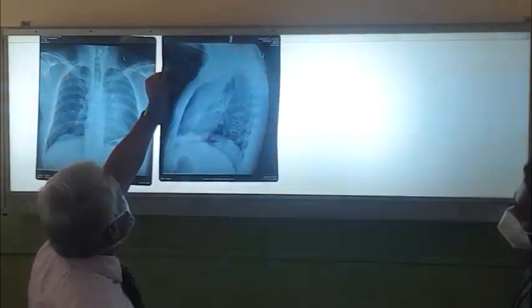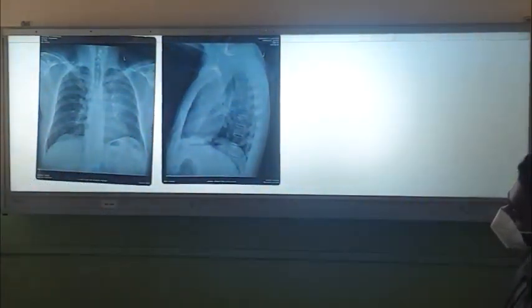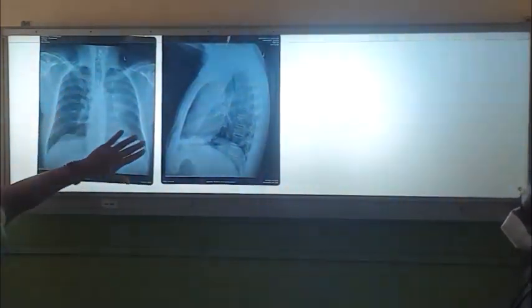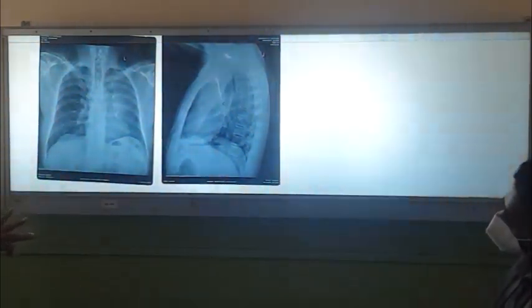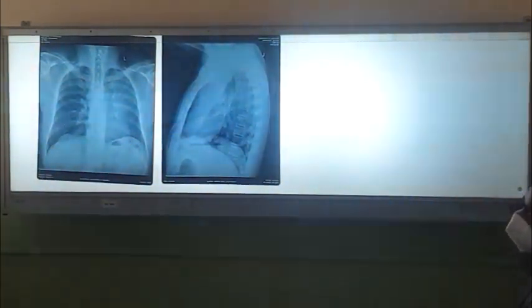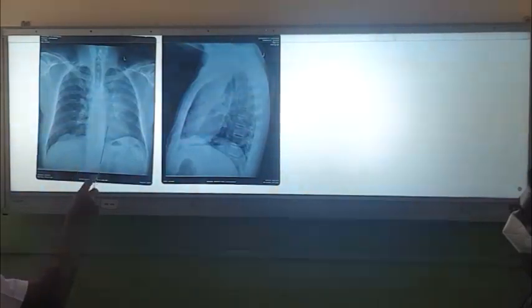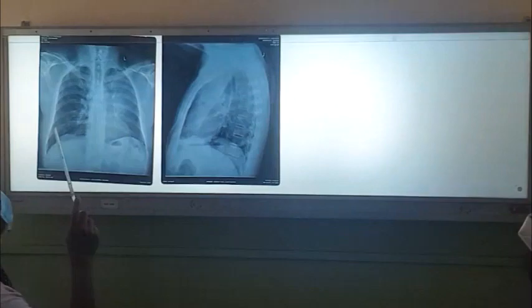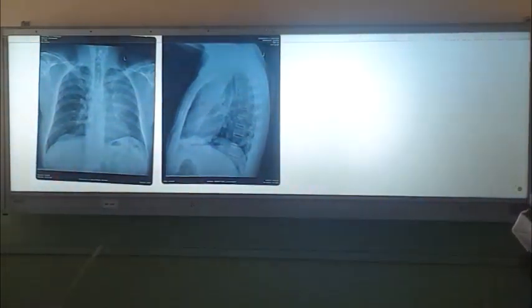Right. Then the different lobes can collapse in different ways. So when you see this X-ray now, it is well centered, but there is haziness here. Haziness here, but you can't see the left heart border, and the descending aorta is nicely seen here. So this is what happens when there is left upper lobe collapse. When there is obstruction to the left upper lobe, it will collapse.